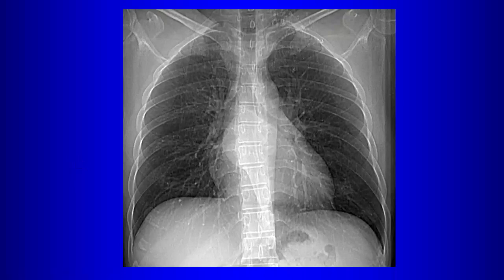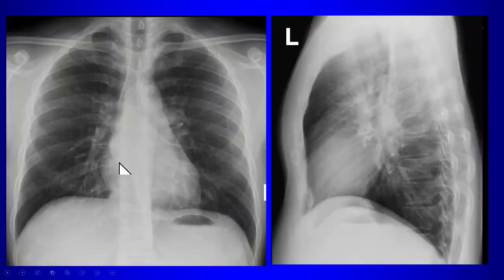So a bronchogenic cyst is a classic subcarinal round lesion, right? So that certainly could do it. Anything else you might think about? So lymphadenopathy, right? So that's something else to consider. So on the chest radiograph, we can see the bulging here, and then hard to see, but there is maybe a little bit of a donut there.